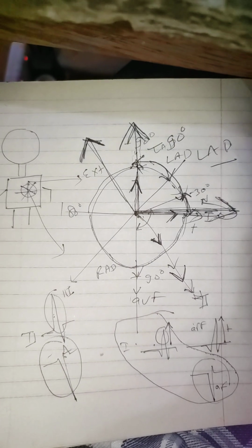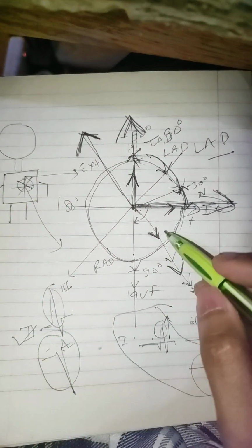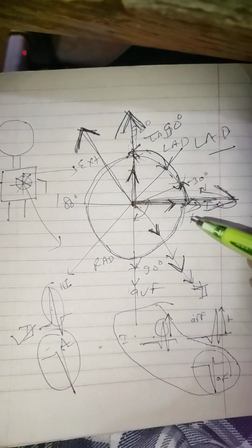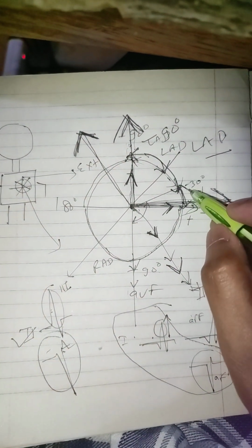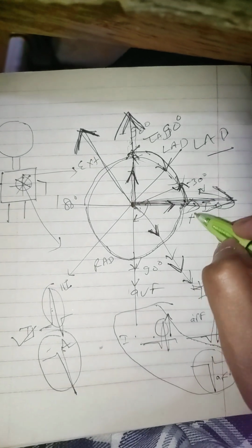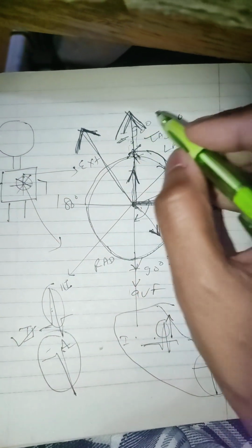So if you get confused, then check lead 2 whether it is positive or negative, and this will help you to determine whether the axis is falling between 0 and minus 30 or is it falling between minus 30 and minus 90.